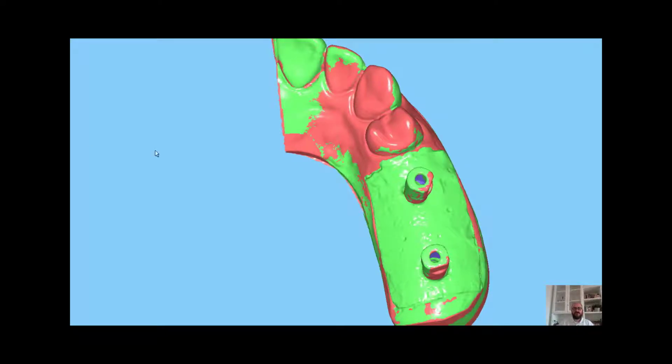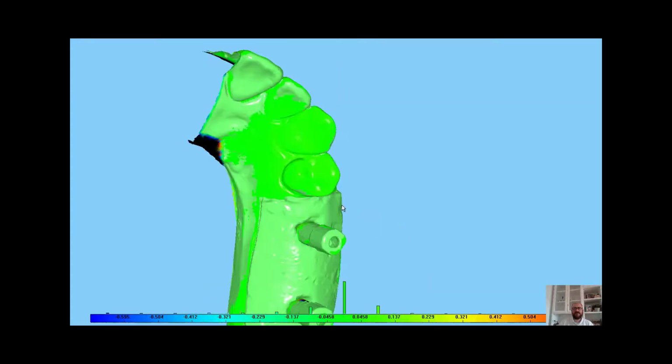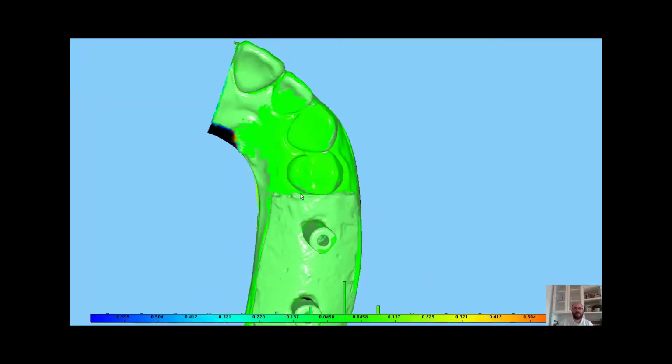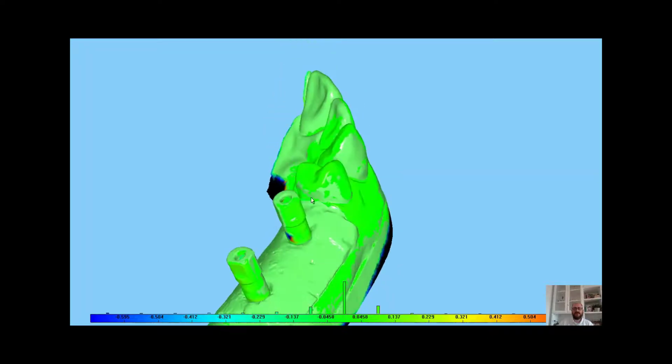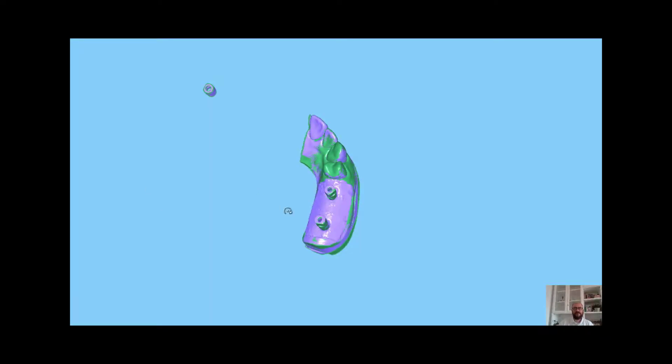It's also in the most common mesh editing tools. Also, a color map is available at the end of the global registration for checking if this process has been performed properly or not. When you see green, it means that it's okay. Done. Apply. So now I have the two acquisition meshes registered between them.